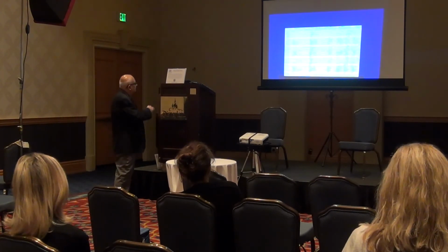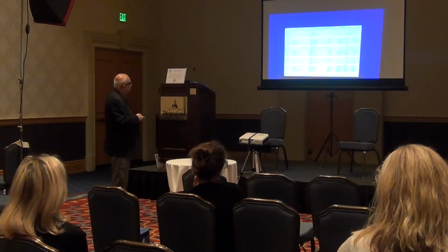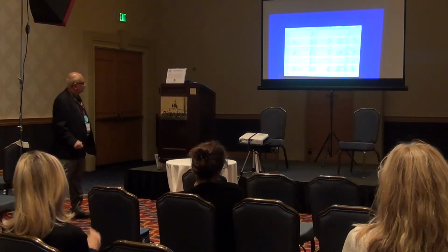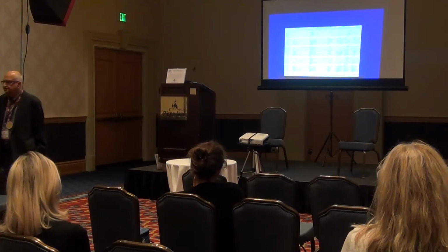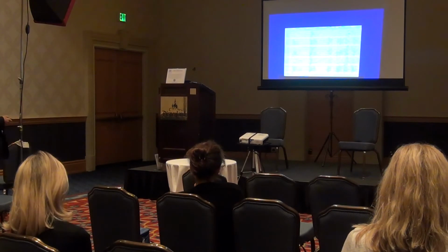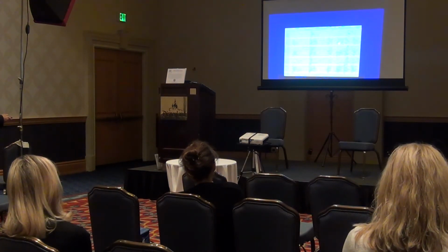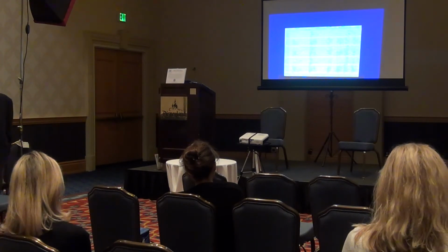So here we have another EEG, and what do you notice here? Just the simplest description is, it's fair to say, bursts of activity punctuated by suppression of the EEG.